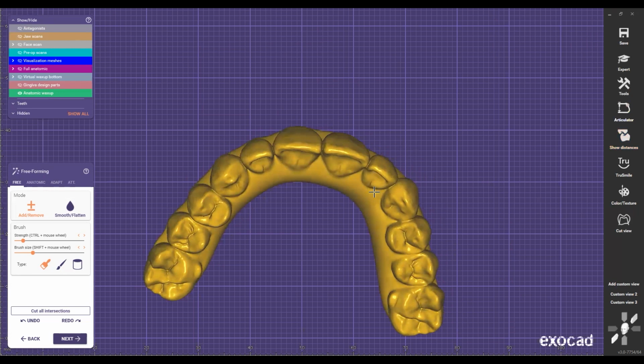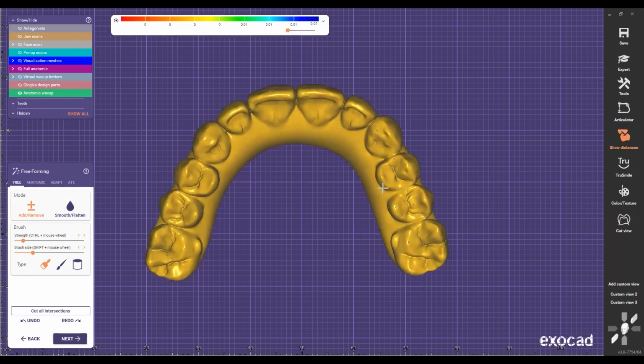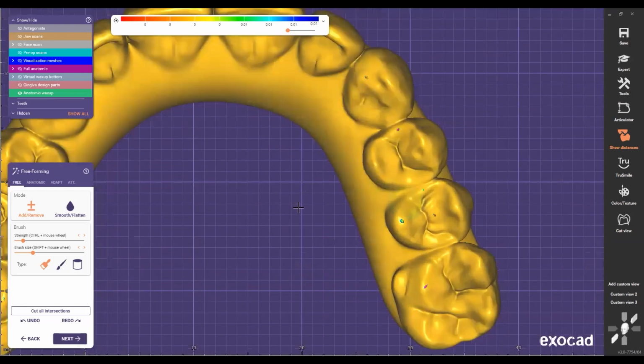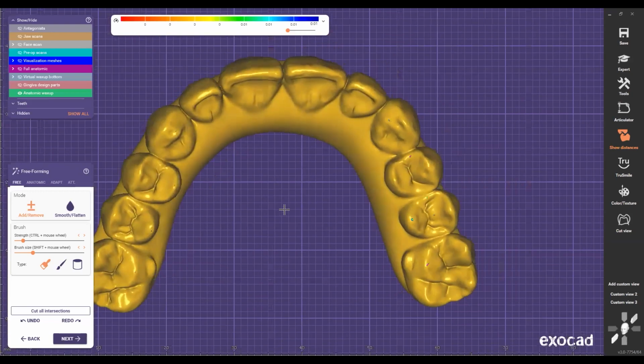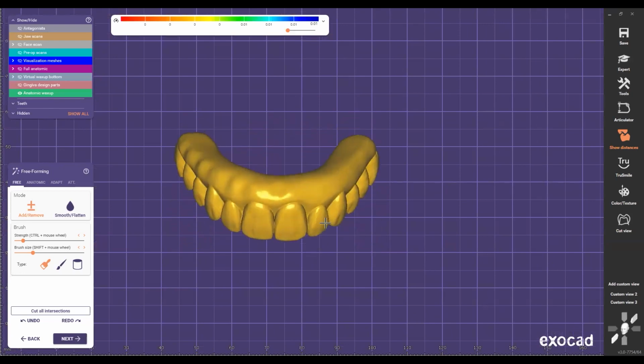So now, once I'm done, I check the contact points. Everything is just hitting where I want it. So when I do the delivery, I want to see the contact points hitting right on those spots. That's why it's important to understand and learn occlusion, because once you do that, your deliveries are just gonna be spot on occlusion.